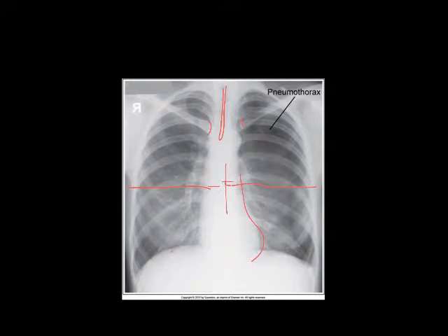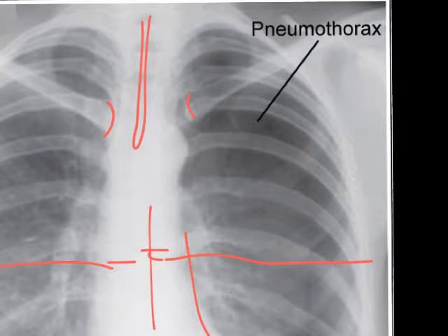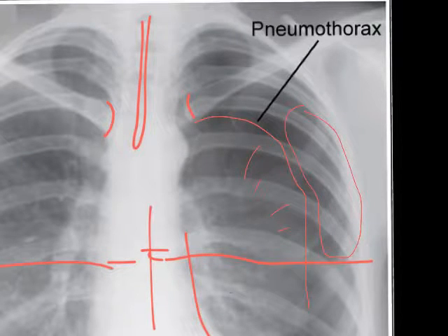As I describe these things, if we zoom in here, we may be able to look at this pneumothorax and point out what we're looking for. With a pneumothorax, it's this line right along here, where we go from seeing a lot of nice little lung markings to seeing no lung markings. I see all these nice little fingerings of the lung, and what's happened is there's an air bubble trapped within the visceral sac around the lung, and that trapped air bubble has depressed the visibility of the lung markings on our image.